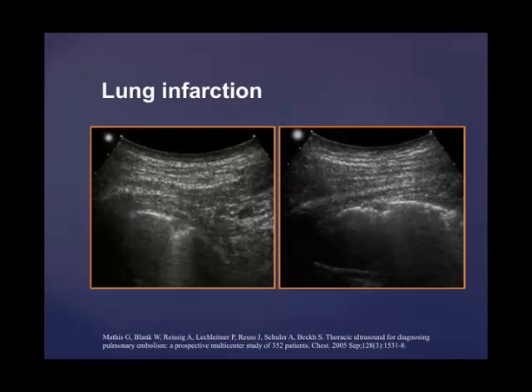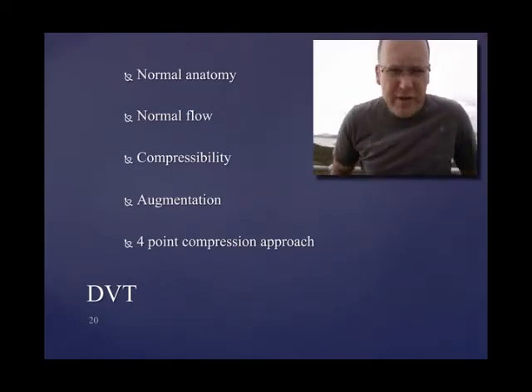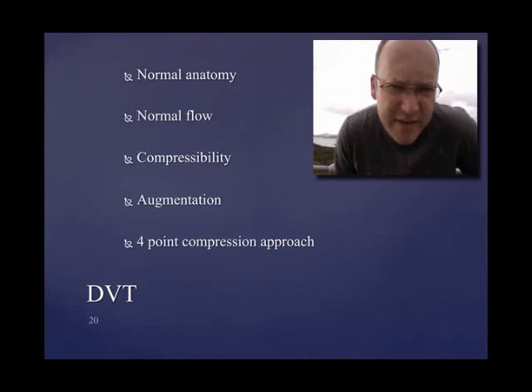Now this is a lung view, and there will be a bonus lecture put in on thoracic ultrasound. This is the chest wall here, here's lung, and here is a very small infarct that you can see in the pleura. It's fairly non-specific, much easier when it's in blue, but to be honest, I wouldn't go looking for it acutely.